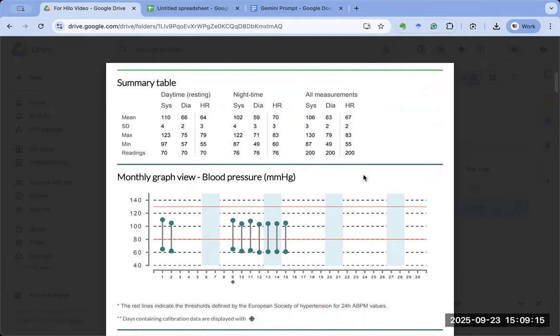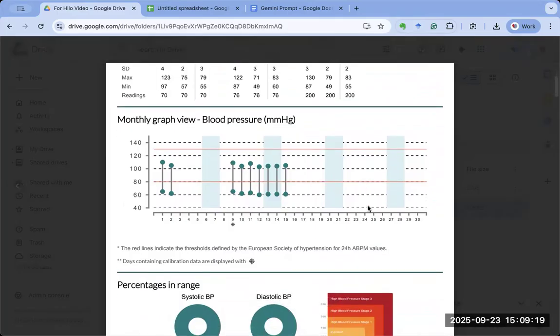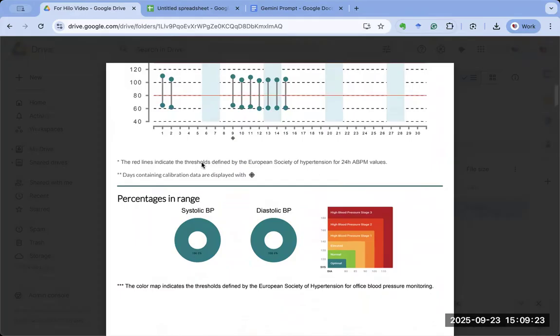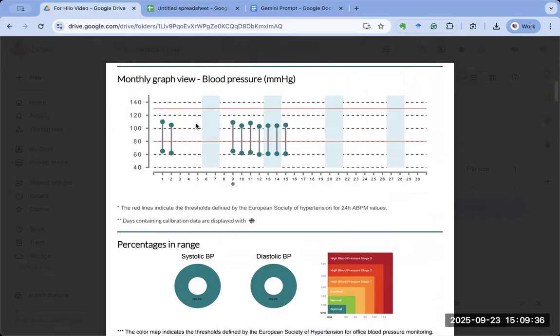So going back to the data, one thing is that these many days of data are missing here. And another thing is you can read this. One more thing I wanted to remind you is many of those devices are still set to the European Society of Hypertension guidelines. Hence you can see that it is 130 by 80. 130 by 80 is not bad.